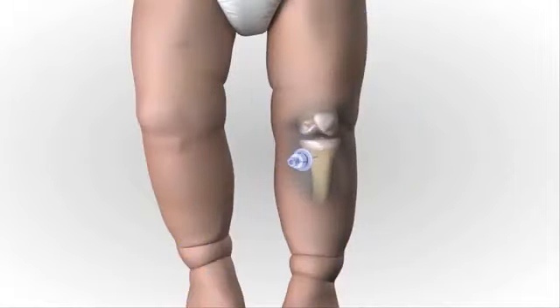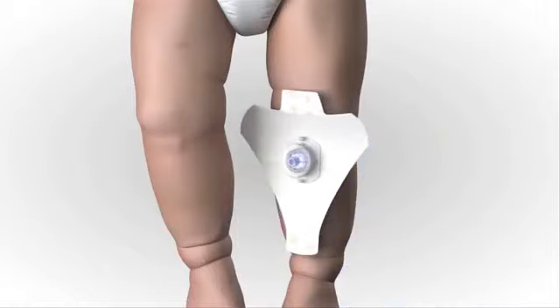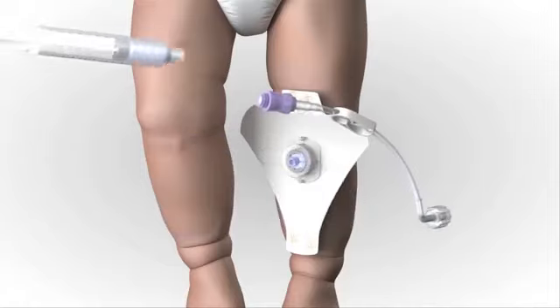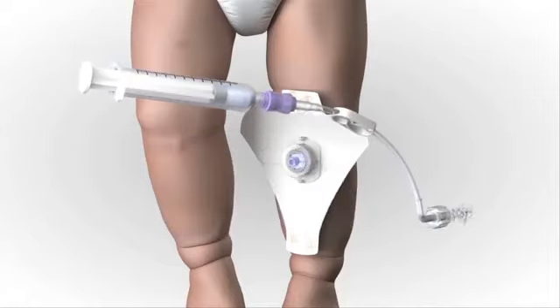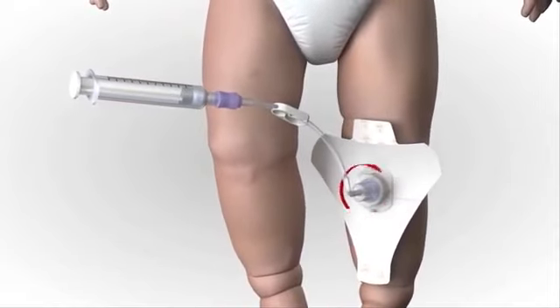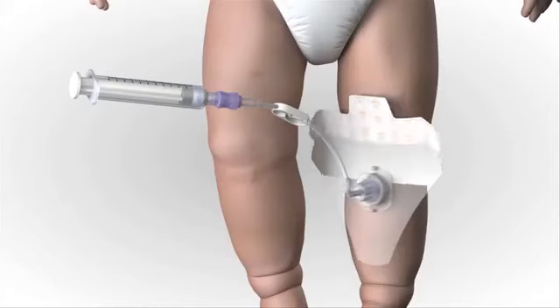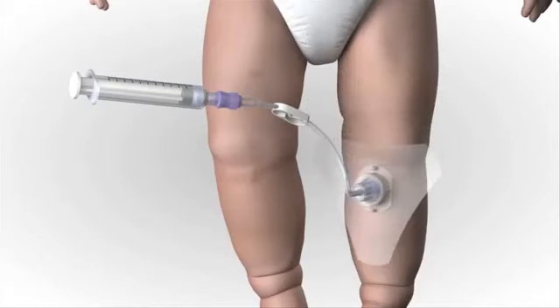The catheter should feel firmly seated in the bone. Place the stylet in a sharps container. Place the easy stabilizer dressing over the hub. Attach a primed Easy Connect extension set to the hub. Firmly secure by twisting clockwise. Pull the tabs off the dressing to expose the adhesive, then apply to the skin.